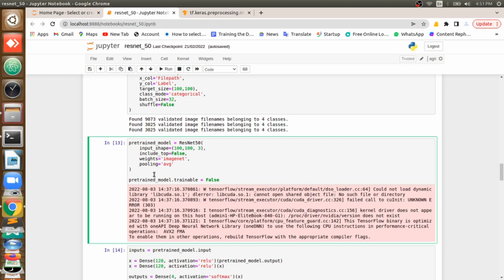As I mentioned, we are going with transfer learning of RESNET50, and I already told you what transfer learning is. For example, in our case RESNET50 is trained for 1000 classes of images called the ImageNet dataset. That is trained for a long time. Now this RESNET50 will know about 1000 classes. If you show anything from those 1000 classes, maybe chair, table, it will say okay, this is chair, this is table, with more than 95-96 accuracy. That is RESNET50. But now we need to use that for our purpose.